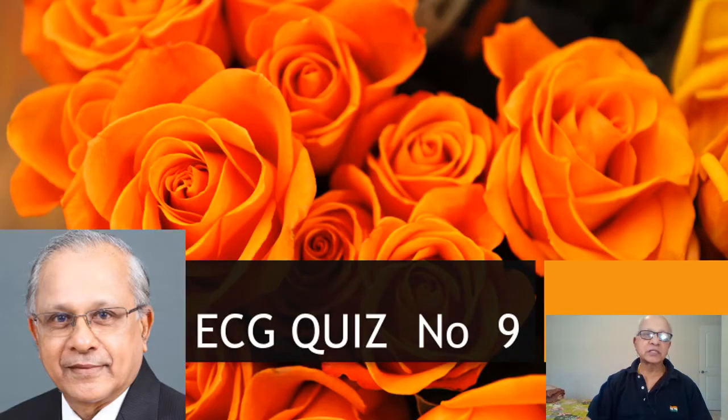Today I will be discussing two arrhythmias and one 12-lead ECG with you. I presume that you are ready with your pen and paper to interpret the ECGs. So let us get on to the ECGs.